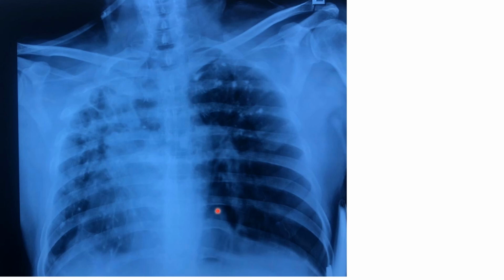And probably there is a compensatory emphysema on the opposite side, this left side, because there is volume loss and fibrosis here. So this is a typical picture. In certain countries where TB is quite prevalent, these X-rays are also quite common in medical colleges.